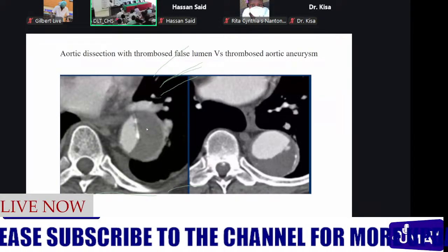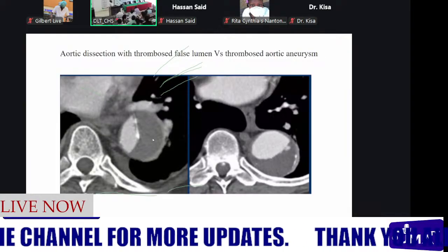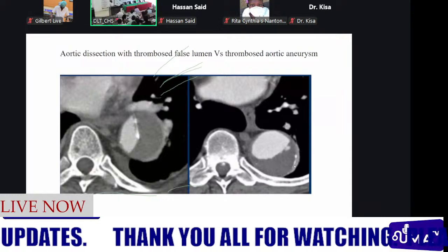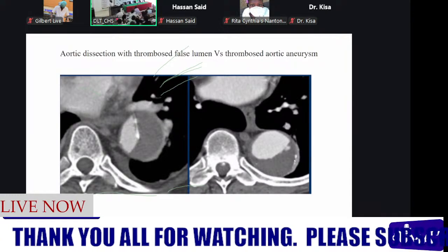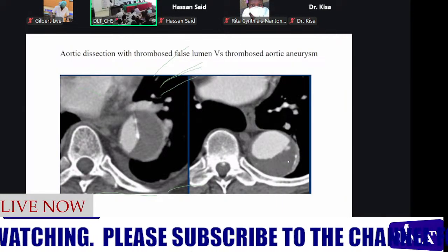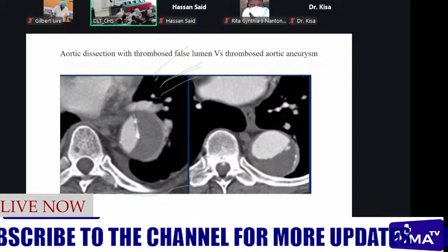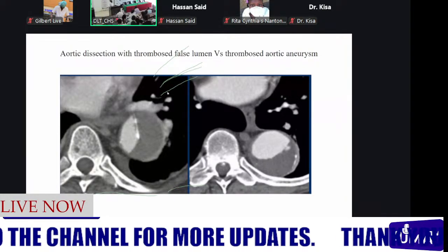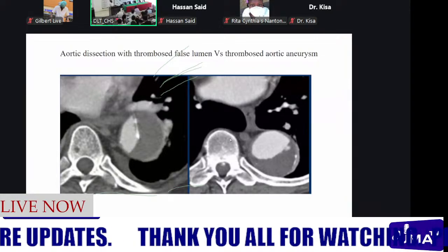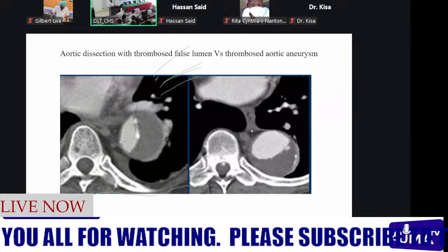In a dissection, they will be displaced medially because blood is tracking behind the intimal layer of the aorta. Whereas in an aneurysm, there is dilatation of all the three layers, the intima, the media, and the adventitia. So the thrombosis happens in front of the intima, so it will displace our intimal calcifications outwards. That's one of the features we can look at. However, in the absence of the calcifications, it may be a little challenging to differentiate a thrombosed aortic dissection from a thrombosed aortic aneurysm.